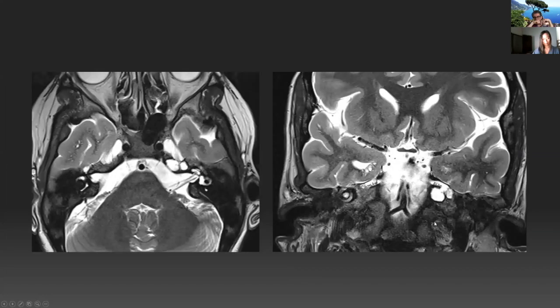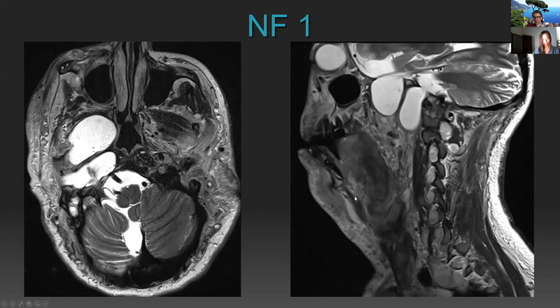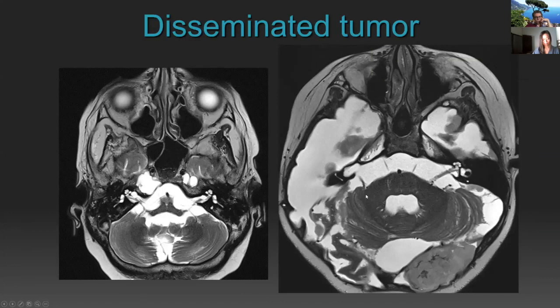Here is an example of a patient with what is known as a cephalocele of the petrous apex along Meckel's cave that is really thought to be a form of arachnoid cysts that then presents on imaging as a cephalocele. Oftentimes, these may be asymptomatic, but again, there is a risk of meningitis. As opposed to this patient who has an underlying diagnosis of NF1, and you can also see cephaloceles in patients with an underlying diagnosis of mucopolysaccharidosis.